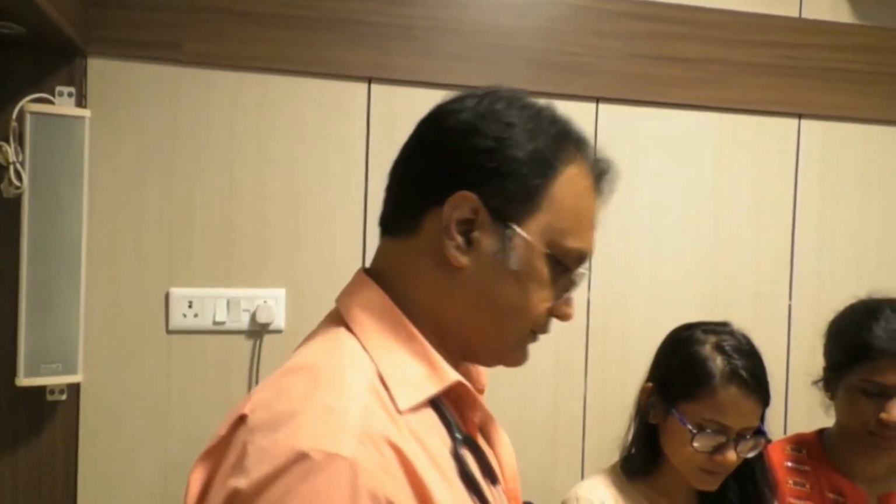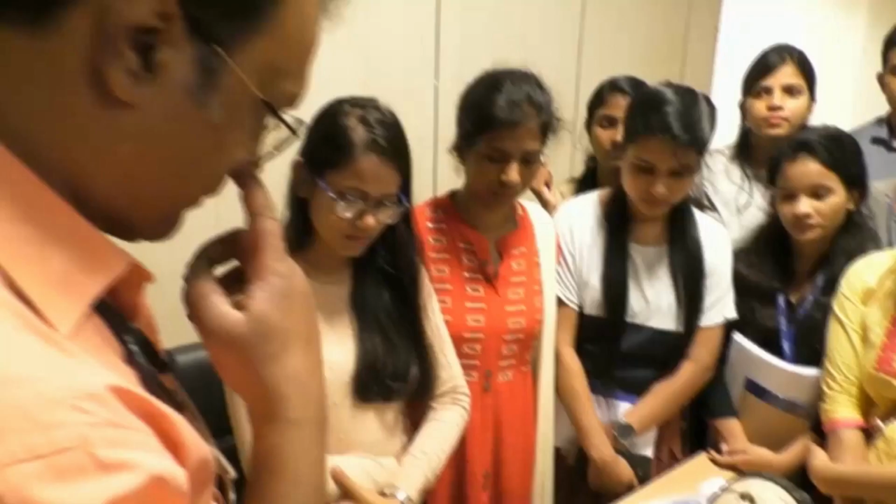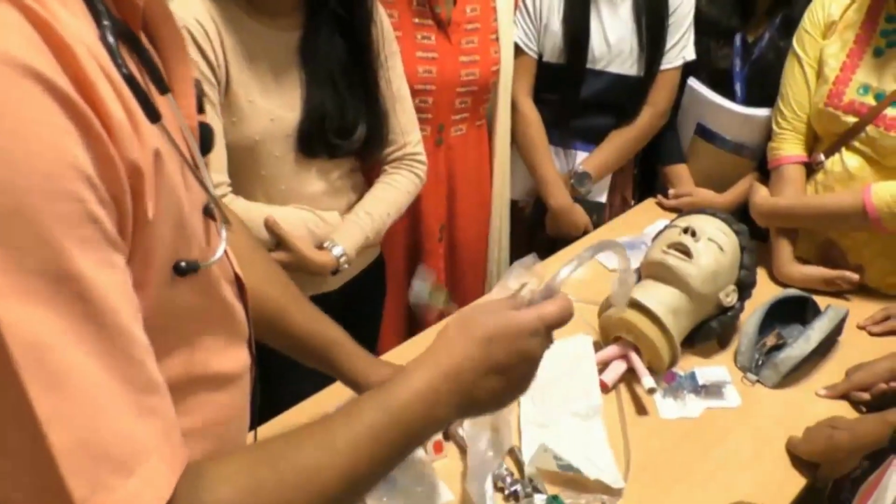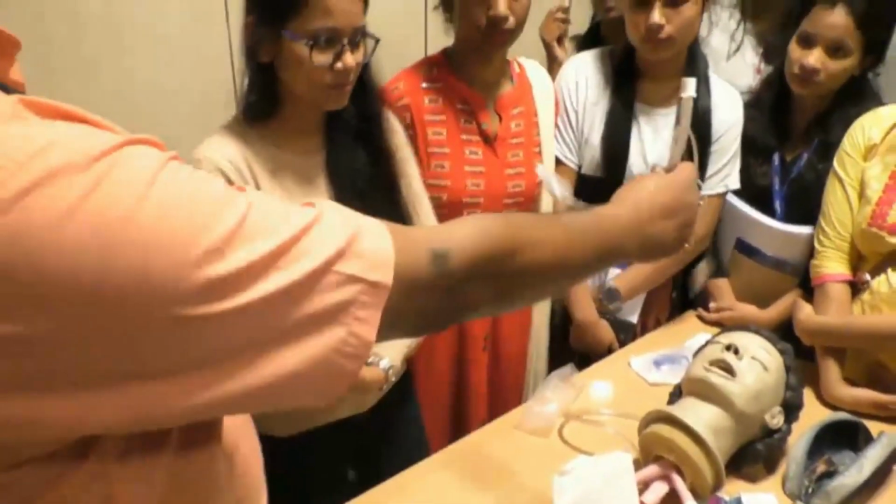ये हो गया. What next? What are the parts? बोलो कोई एक आदमी.